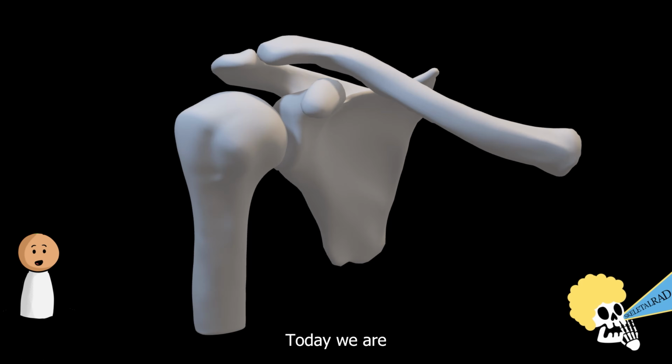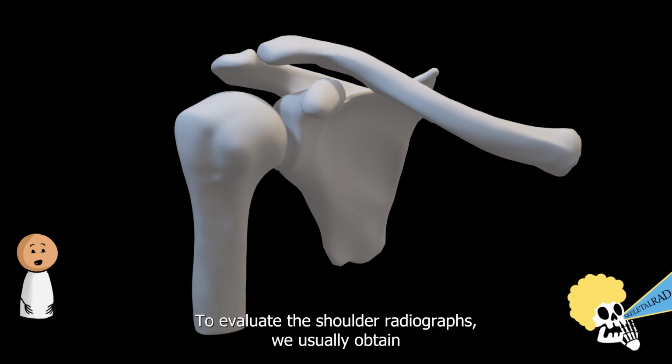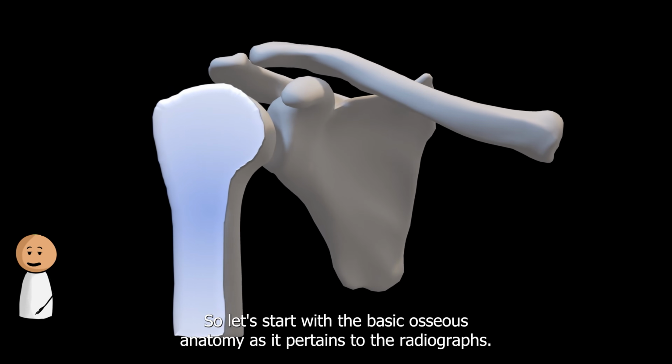Hello there. Today we are going to talk about the basics of shoulder radiographs and osseous anatomy. To evaluate the shoulder with radiographs, we usually obtain 2 to 6 views depending on the clinical history. So let's start with the basic osseous anatomy as it pertains to the radiographs.